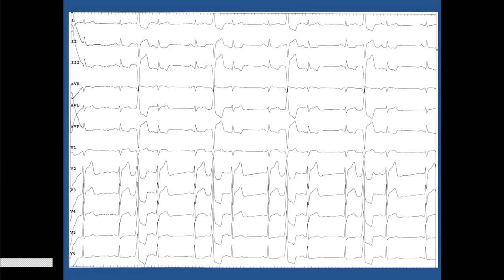This is a very interesting ECG where you're seeing a bigeminy. They can also have VTs, but this is a bigeminal ECG, very narrow. That means it is coming closer to the septum. QRS width close to the septum. QRS is negative here, and then suddenly V1 is deep negative, V2 is positive. This is a pattern break. Pattern break is a crux VT. And 2, 3, aVF is deep negative, so it is most inferior. It is the crux.